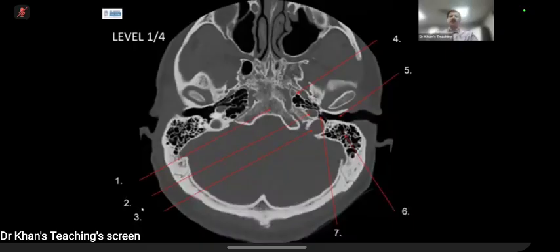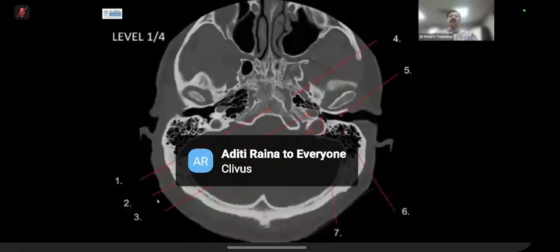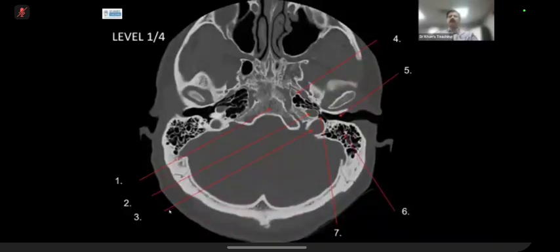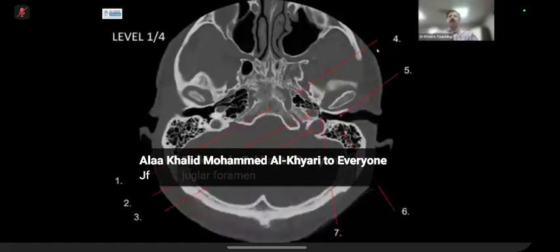Good. Number 2. Okay. I'll give you the answers in the next slide. Number 3, what is this? Number 3. Excellent. Then number 4.